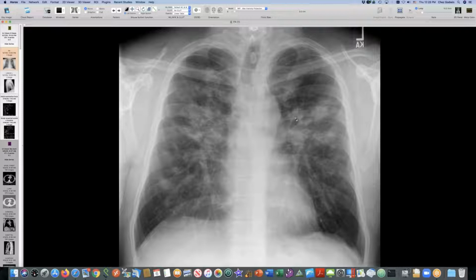Okay, here's another person who has upper lung findings that look a lot like progressive massive fibrosis, mid and upper lung stuff with these big blobs. Some a little bit of distortion, not like that last case. And you know, the differential diagnosis of this is sarcoidosis versus silicosis. So this is what his chest radiographs look like. This is a case that Sudhakar gave to me. And here's what the CT is.